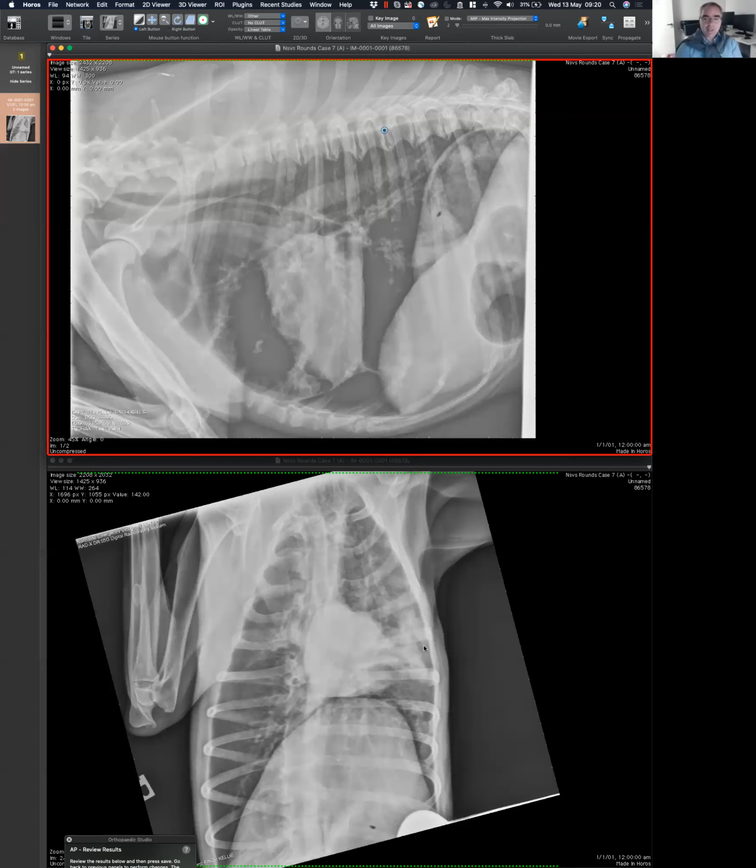They can be in the same, though increase. They could be increase and decrease, but where are they? You know, what is happening? Yeah, I think there is both. In this area, you've got the increased opacity. Okay. And then I think over here, you have actually here, a decreased opacity everywhere else. Cool. I like that.